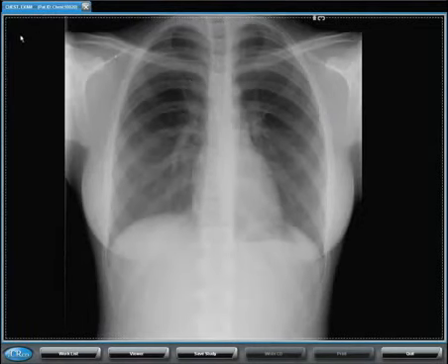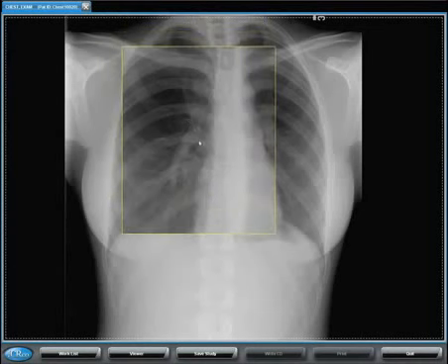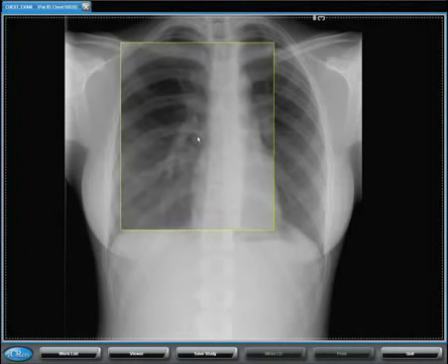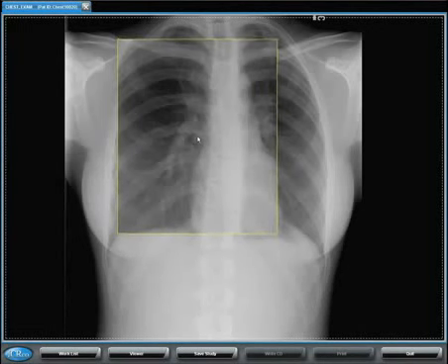However, those can be changed by simply coming over here, selecting the new tool. We're going to use the magnifying glass. I'm going to map the left button of the mouse to the magnifying glass, and by selecting the magnifying glass now from the left button, I open my magnifying glass and I can use my arrow keys: up to increase the level of the magnifying glass, down to decrease the level, right arrow to increase the size of the magnifying glass, left arrow to decrease the size of the magnifying glass.